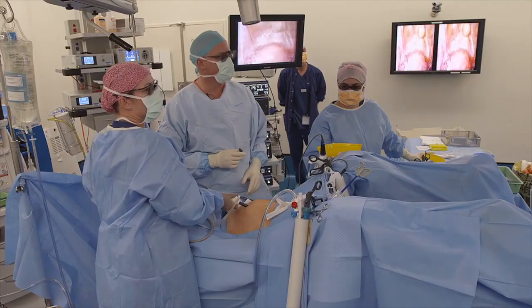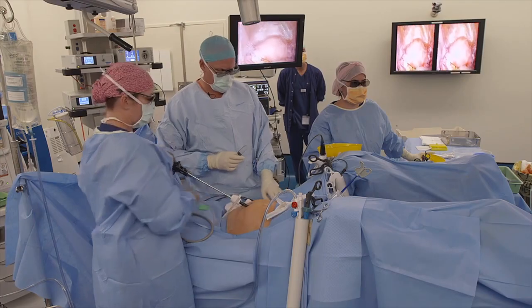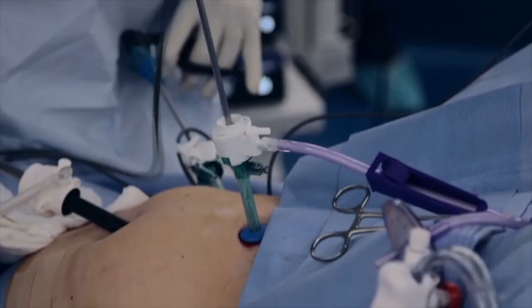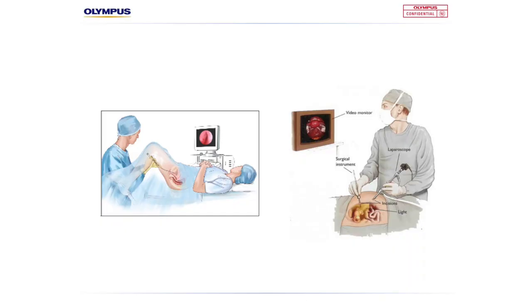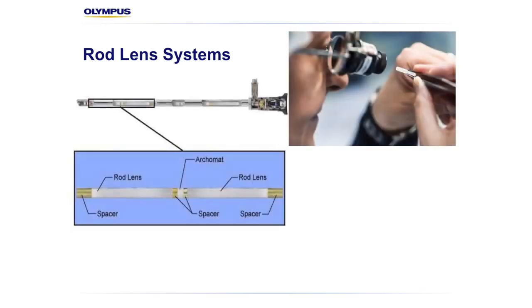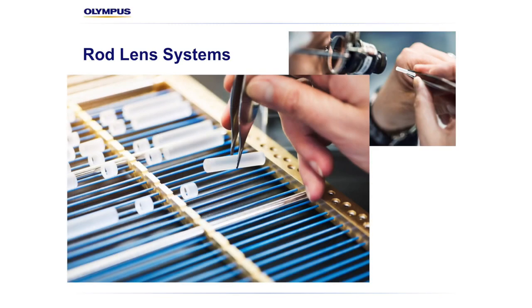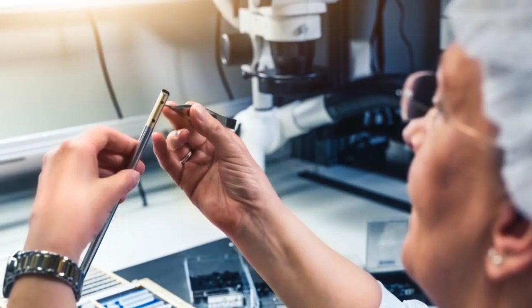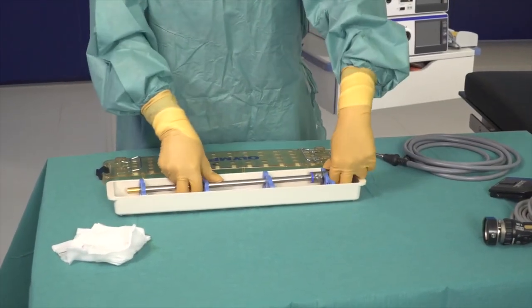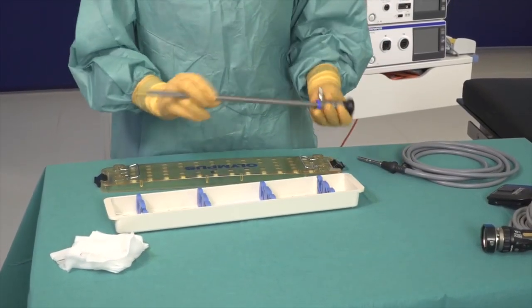The aim is to achieve the best possible view of the target tissue for either diagnostic or therapeutic purposes, whilst causing the least possible trauma to the surrounding tissue. Telescopes allow us to carry the surgical scene outside of its cavity and project it onto an ergonomically positioned surgical monitor. To maintain a high-quality image where no detail is lost, telescopes must be made from specialised glass lenses and fibre optics, which means they need careful handling. Furthermore, consider that the lens of the telescope is our surgical eye and it must be kept clean at all times.